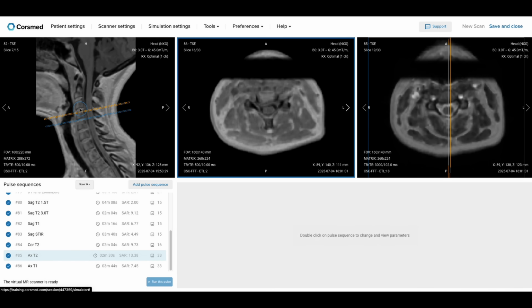It's ideal for assessing vertebral body integrity and bone marrow pathology, such as metastases. It also helps us detect fat-containing lesions like lipomas, as well as subacute hemorrhage. Finally, the pre-contrast T1 also serves as a baseline image before we use gadolinium contrast. The post-contrast T1 then helps us check for tumors, infections, or demyelinating lesions. Overall, T1 is critical for evaluating marrow composition, structural integrity, and anatomical landmarks.